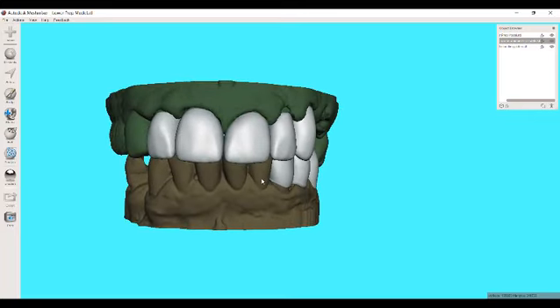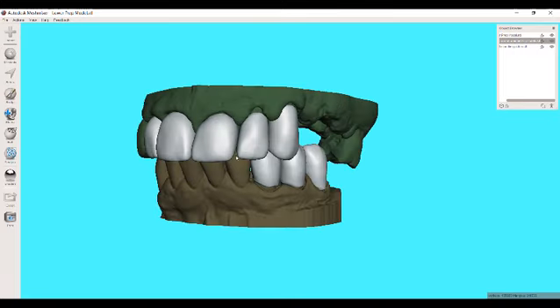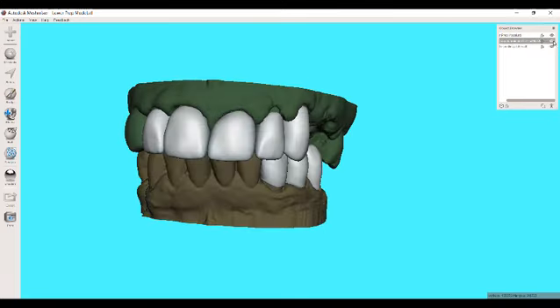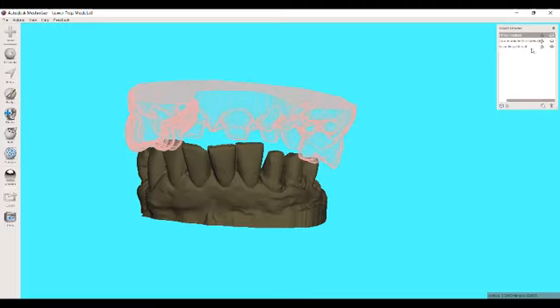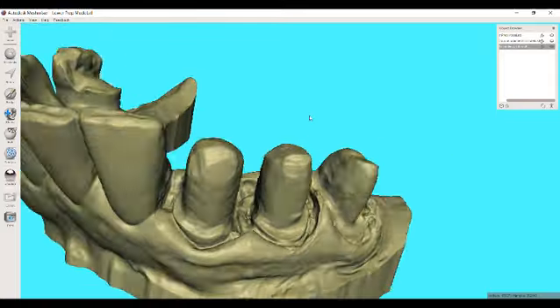I'm going to show in this video how I would go about doing a ditched die model for printing crown and bridge models. So this is a case I just designed for someone, 8 restorations. But one of the things about it is that the models, they had to do a lot of tissue retraction. And so there's areas where there's tissue overlaying it.